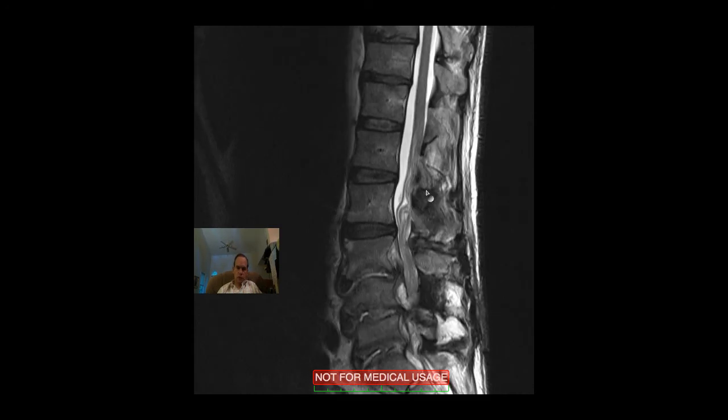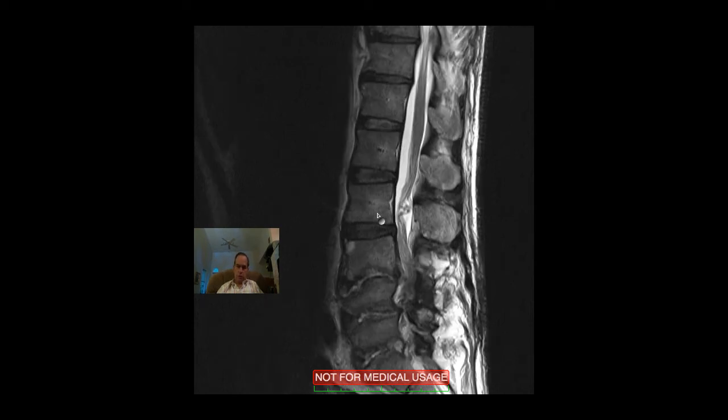And more of the same. Here again is that, here's the conus right here. You can kind of make out that this is cord here, and that somewhere here it transitions to a bunch of nerve roots. And this is unusual for the nerve roots to be kind of clumped together in this fashion due to, I presume, the central canal stenosis below that won't let the nerves slide smoothly up and down as the patient bends forward and backward.